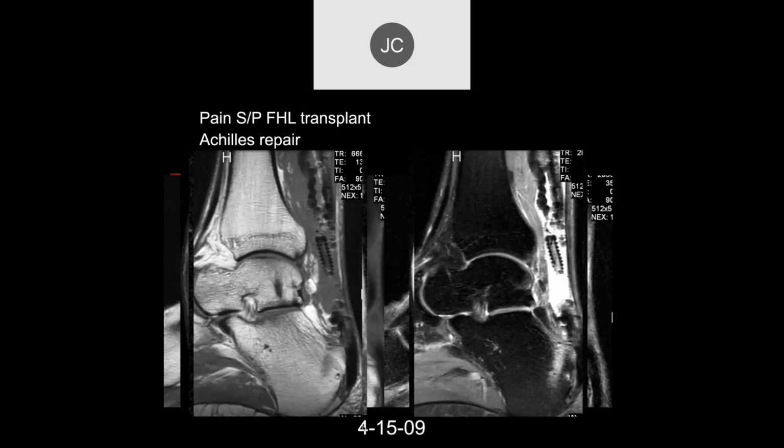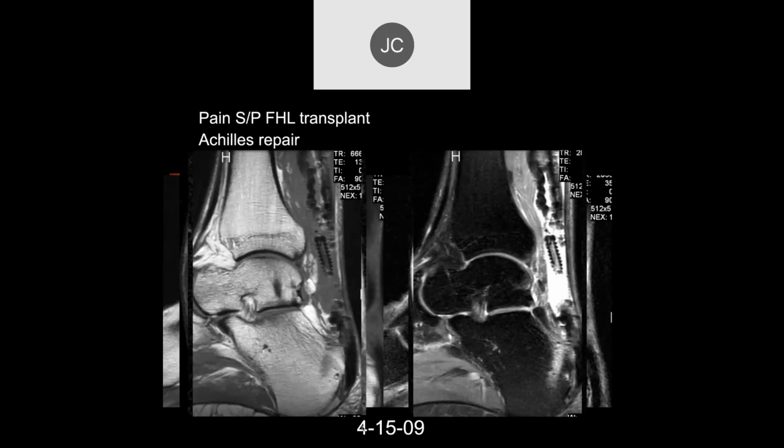I don't think this is a technique recommended by Campbell's. I've never done a technique like this. I operated on a few when I was a resident, but this is condemned in my opinion. That's just never going to happen. I mean, never going to heal. A single screw, at least that's all we see is a single screw. So, Eliar, what do you think?